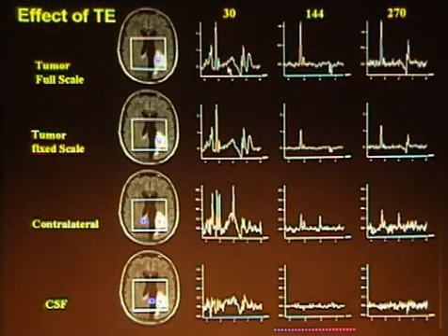If you were to look at the second thing, there are a couple of take-home messages here. The second thing is that if you look at short echo time, you may be misled to think that there may be some NAA here within the spectrum, but in fact, as you go to longer echo time, there's no NAA at all. So the pitfall is that at short echo time, you may be misled because the GLX peaks give you the impression that there may be some NAA within the spectrum, whereas as you go to long echo time, there is really no NAA at all.